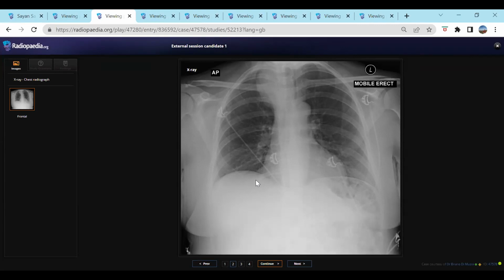Since the upper neck is not covered, the possibility of this extending from the neck cannot be entirely excluded on this current projection. What are your DDs? So this can be a posterior mediastinal mass, or a mass extending from the neck. Could be a neurogenic tumor or a thyroid mass. Yes, that's absolutely right.